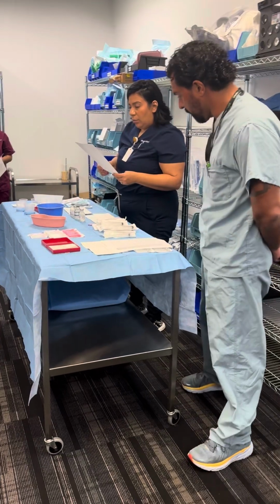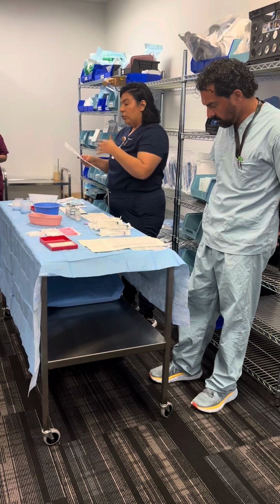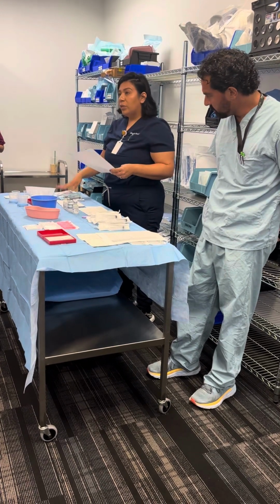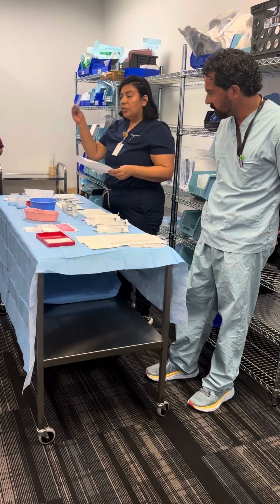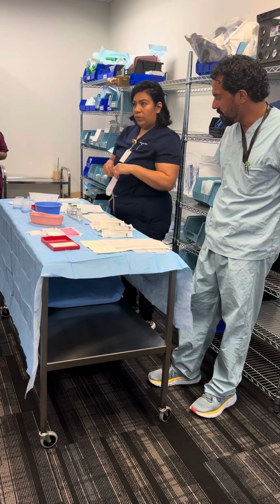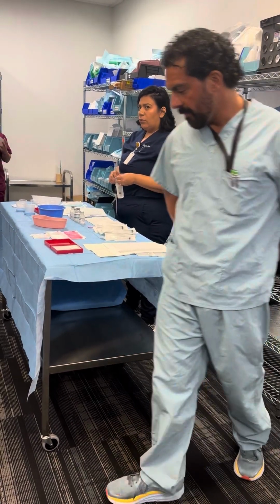So, we're gonna have a testing station. Mr. Nick, myself, or Miss Tracy, or Miss Vanessa, we will be testing you on if you know how to read the syringe length, the syringe. So, a syringe is comprised of what? We tested on this. You had a test. Maybe that's a 103. Correct.